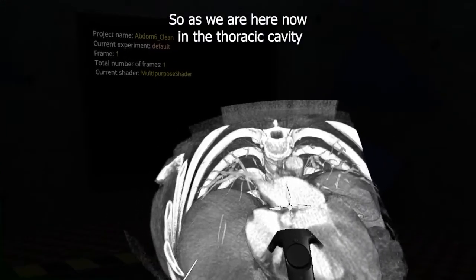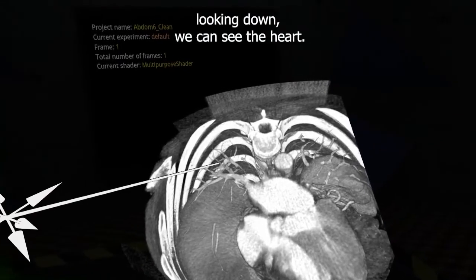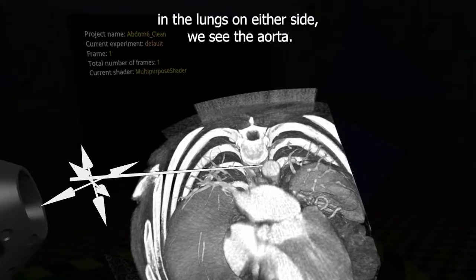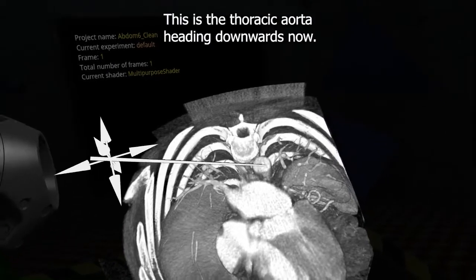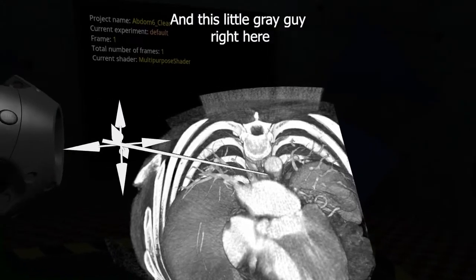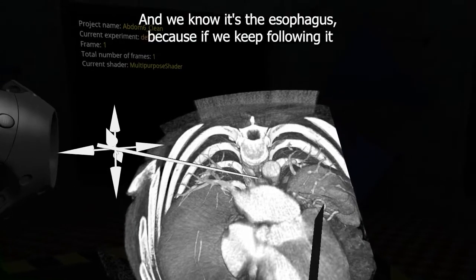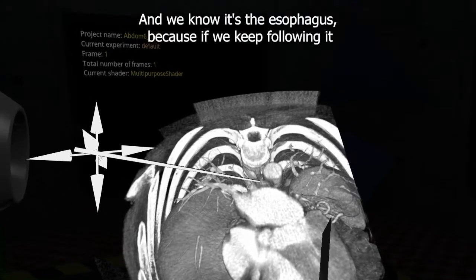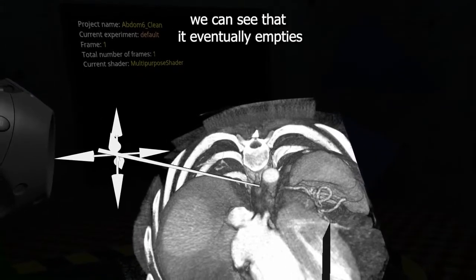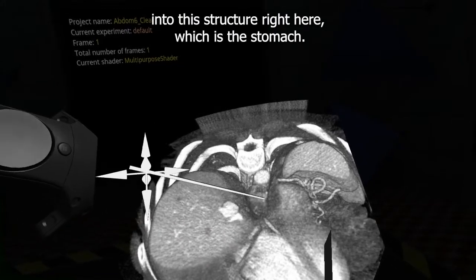So as we are here now in the thoracic cavity looking down, we can see the heart. We have our airways in the lungs on either side. We see the aorta. This is the thoracic aorta heading downwards now. And this little gray guy right here, that is going to be our esophagus. And we know it's the esophagus because if we keep following it as we cut down through the data set, we can see that it eventually empties into this structure right here, which is the stomach.